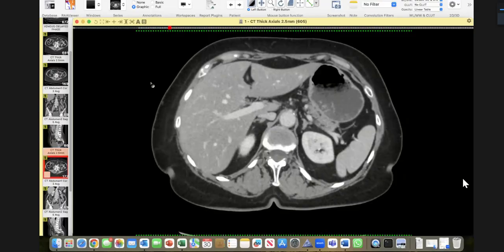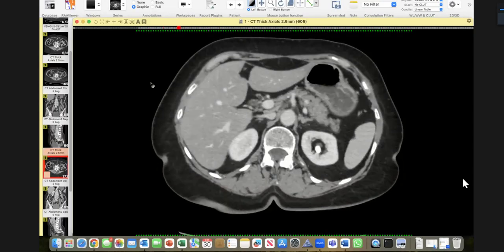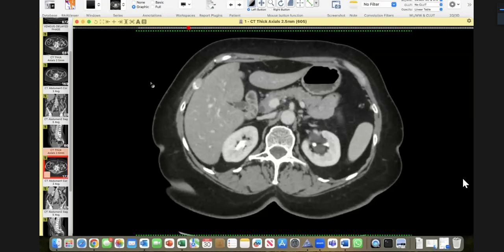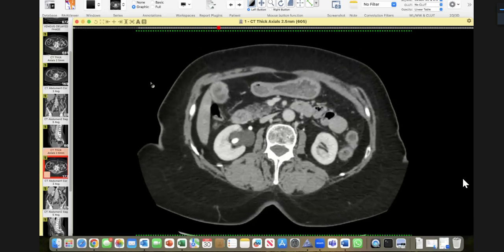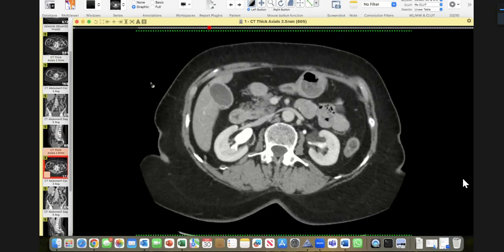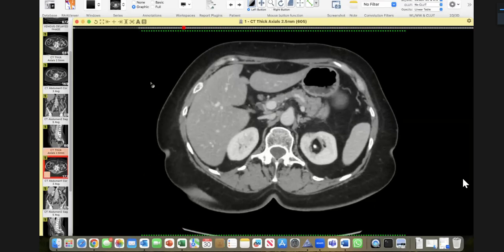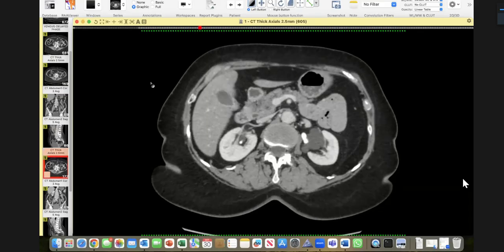In my practice, to be more sure, I'd measure the HU density pre and post contrast to ensure that it is really not enhancing. However, subjectively, it doesn't appear to be enhancing. So these are likely bilateral parapelvic cysts that can have a slightly proteinaceous component, owing to this slightly more than hypodense content, and these are not hydronephrosis, and there is minimal pelvic ectasia, maybe due to the compression of the system.